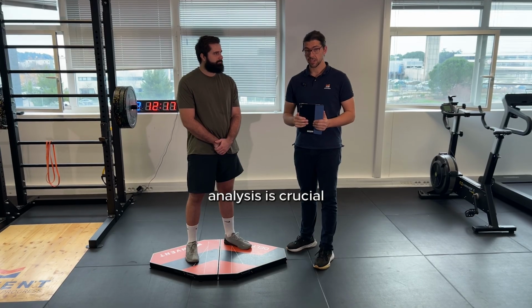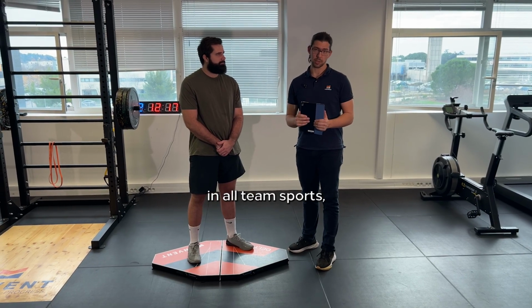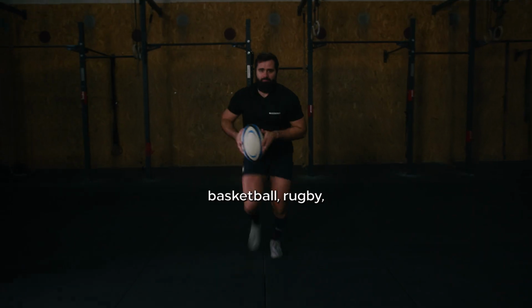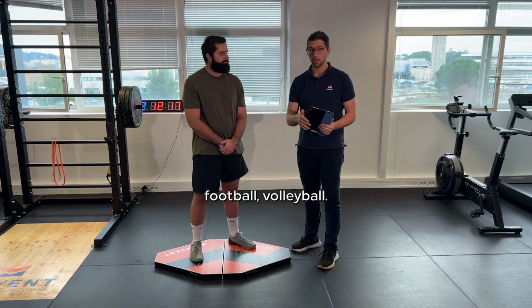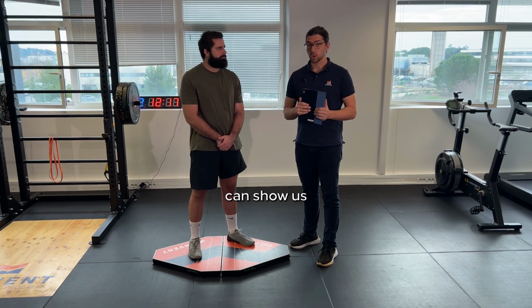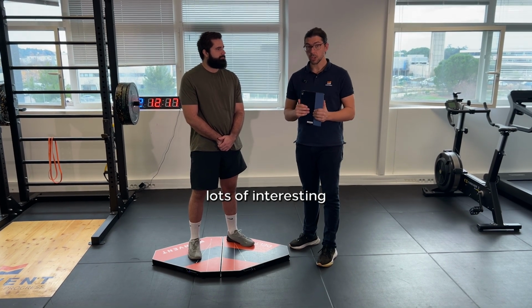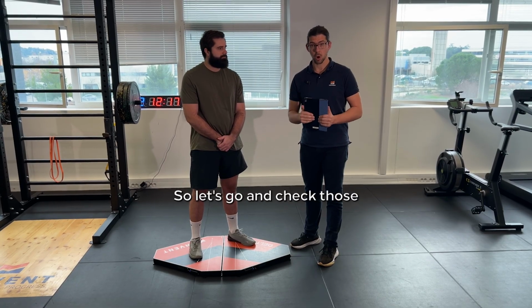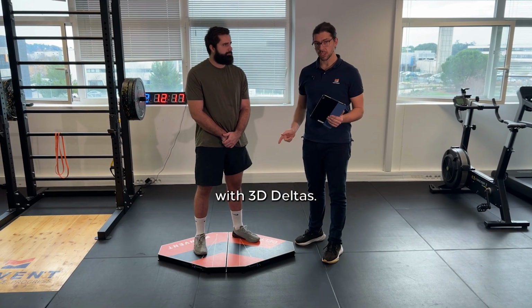Lateral jump analysis is crucial in all team sports, whether it's handball, basketball, rugby, football, volleyball. Lateral jumps, also known as skater jumps, can show us lots of interesting information on performance and injury prevention. So let's go and check those with 3D deltas.